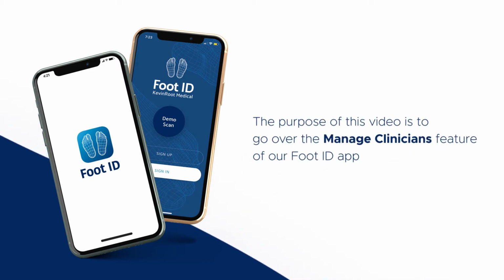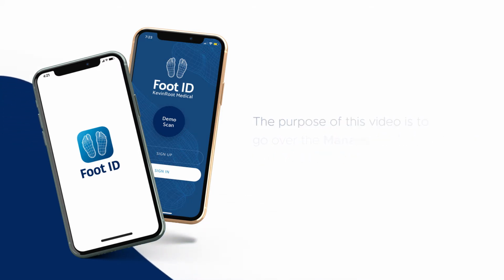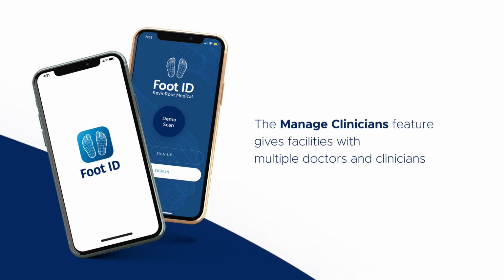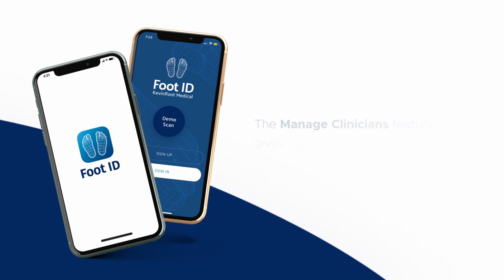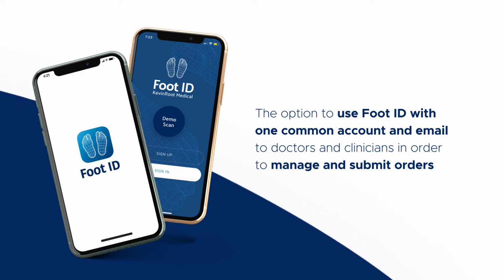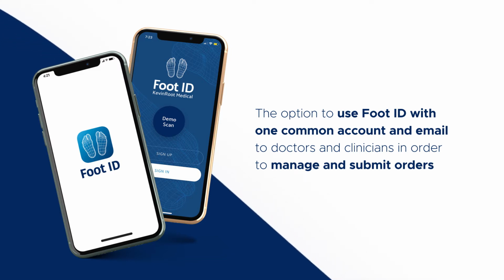The purpose of this video is to go over the Manage Clinicians feature of our Foot ID app. The Manage Clinicians feature gives facilities with multiple doctors and clinicians the option to use Foot ID with one common account and email, or assign individual emails to doctors and clinicians in order to manage and submit orders to the Kevin Root Medical Lab.